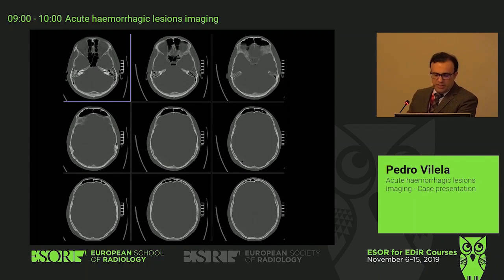It was already pointed out, so we are looking into the bone. Yes, I can see a fracture line on the right occipital side, and it's not a suture. It's a real fracture without step and without impression. Any pitfalls on the imaging that we should be alert to having a fracture? Additionally, what do you think about where this is coming from?